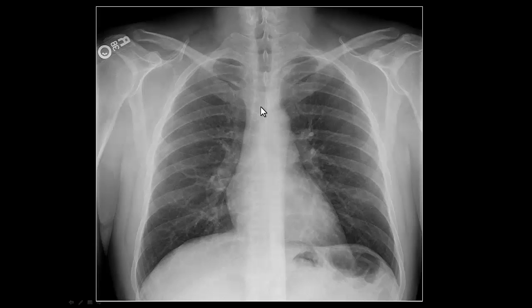This is a quick video on how to assess proper chest X-ray technique. First we'll look at rotation. We can draw a line through the midline and the medial clavicular heads and make sure we make nice symmetric 90-degree right angles. If there's any asymmetry of the clavicular heads, then there's likely rotation.